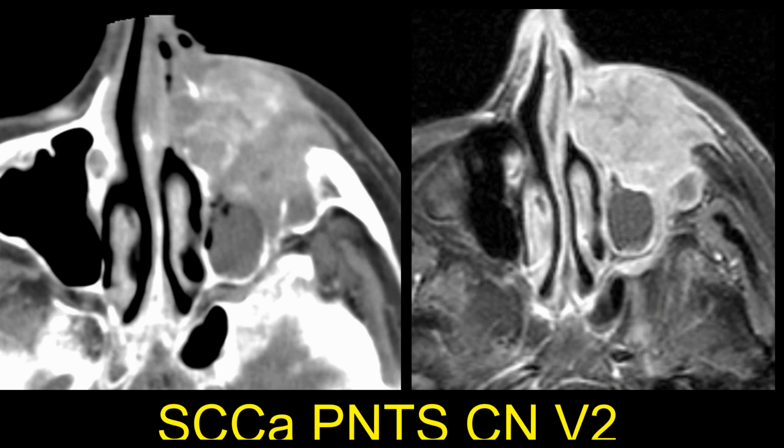So we look on the CT to find out where there's normally fat in the pterygopalatine fossa, and we want to window the CT so that fat is different than air, so we can differentiate that. But we look for replacement of the fat of the pterygopalatine fossa. That's a very important way station of the deep face. We'll talk more about it in upcoming lectures. But we look at the post-contrasted imaging for perineural tumor spread. And if we're looking at the pre-contrasted T1, we think about loss of fat along the nerve itself.